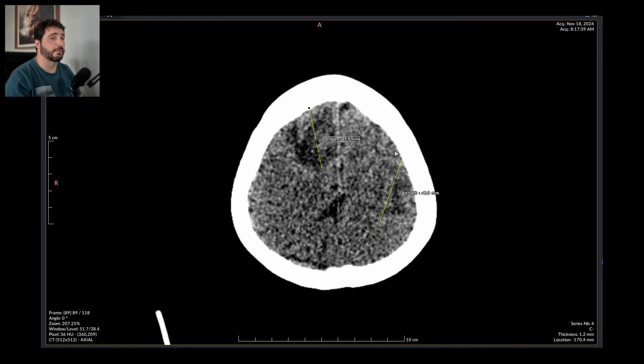There are 2 frontal lobe lesions and 1 basal ganglia lesion on the right. And we are done. Not even the CT scans of the brain are easy today.